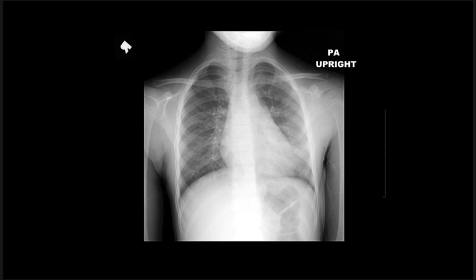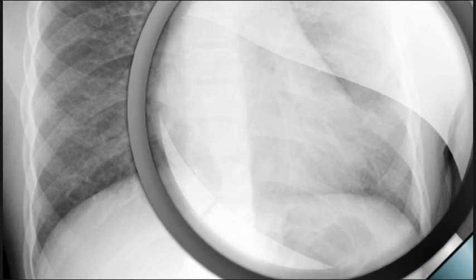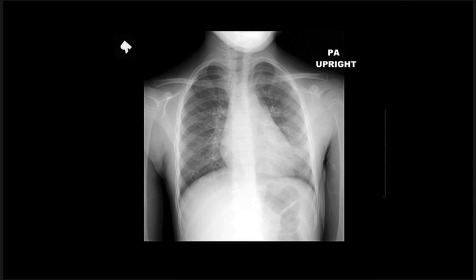So we've got a frontal chest x-ray, and right along that left heart border we've got some white stuff. We'll take a closer look at that. Let's blow this up, get rid of this magnifying glass so we can see a little bit better. And if we trace the border of the heart here, you can see that we lost a portion of that interface. We can't see that. This is the silhouette sign, and what we know is that we've got soft tissue density. It's the same density as the heart, and it's touching that area of the heart, right? Because that's the two components we need for the silhouette. So knowing that, we can predict where that pneumonia is at, because it has to be touching the heart, right?